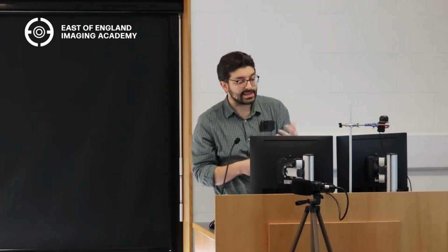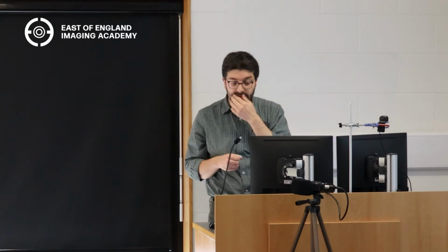So if you've got clot in the arteries, the artery will be nice and bright, except where you've got the clots. So you get a little dark filling defect where the clot is. Does that make sense? Yeah. So that's basically what you do if you're doing a CTPA.